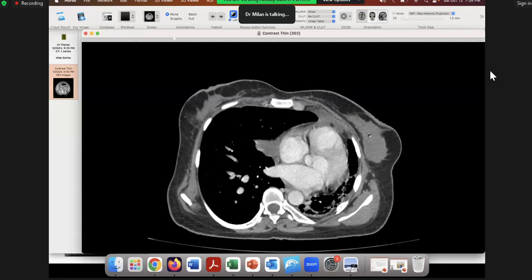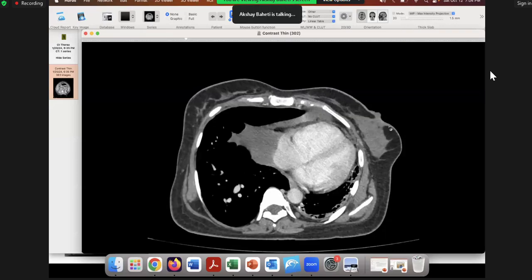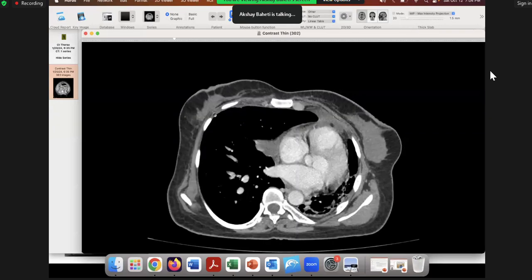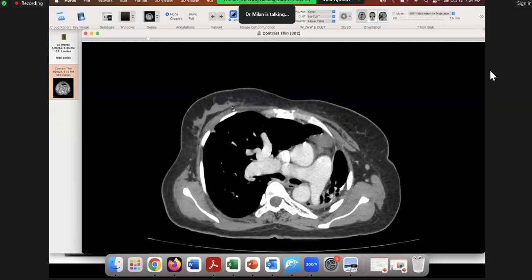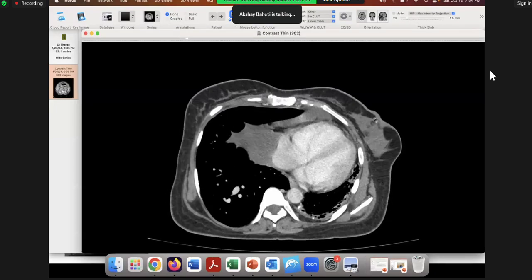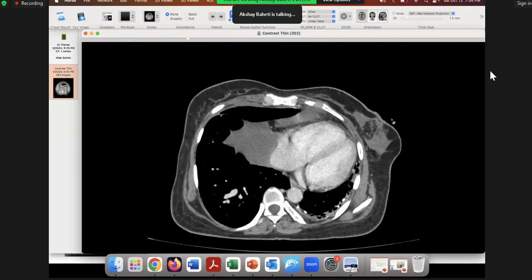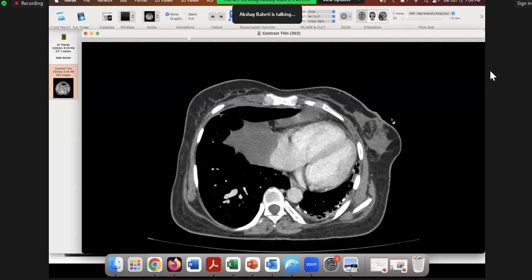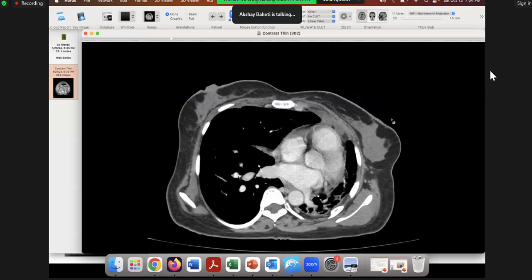No, sir. I think this is, most of it at least. Do you think all of this is mass here and all of this is mass on the right side? No, sir. It looks like normal breast parenchyma. Yeah, so this is breast parenchyma, right? So, if you see a well-defined enhancing lesion, which is well delineated or spiculated, certainly that can be a breast primary.